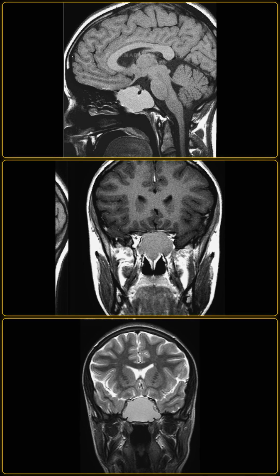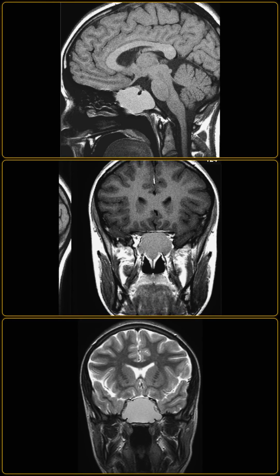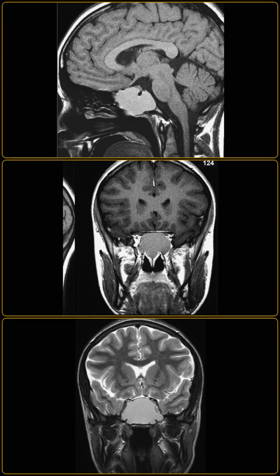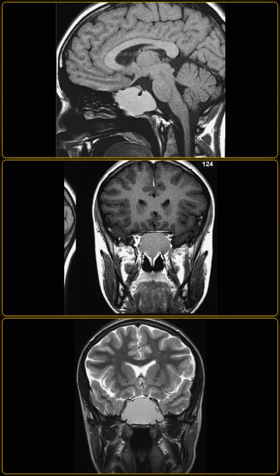A 24-year-old female presented with chronic headaches and visual loss. I'm showing you T1 sagittal, T1 coronal, and T2 coronal brain and orbits MRI scans. Describe the findings. All right, let's take a look.